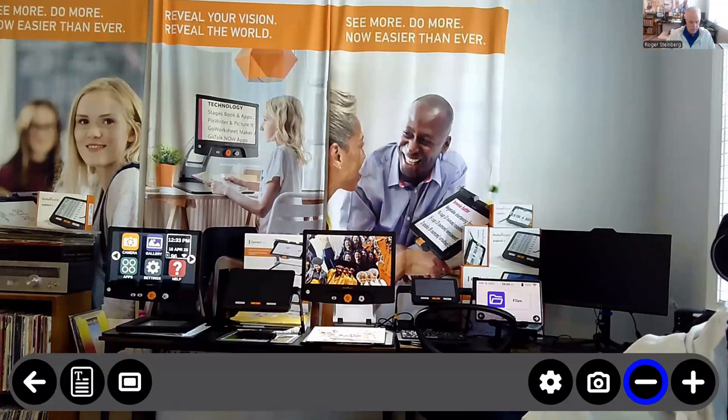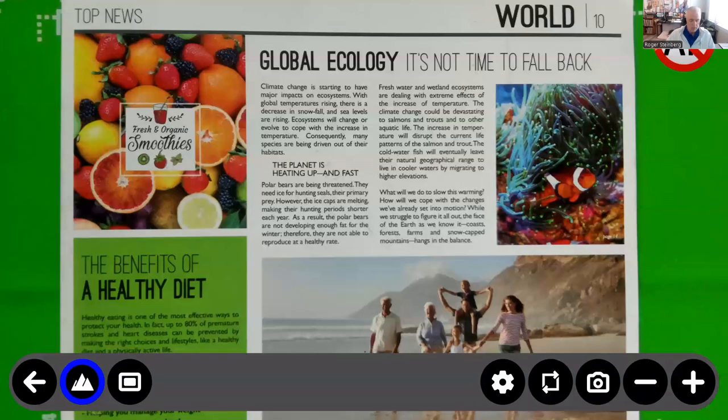So I can move smoothly and efficiently between those two cameras with that second icon. Notice that it's now got a T there for text or document. That's because typically for our down-facing or magnifier camera, we're going to be looking at text-based documents and that sort of thing. So I can go between those two cameras very quickly.